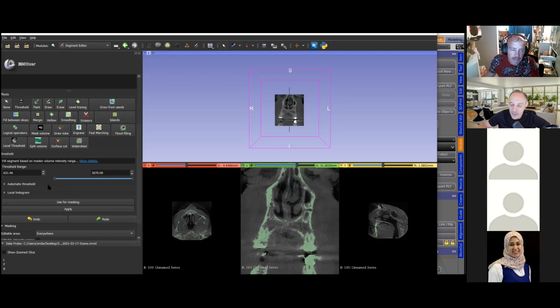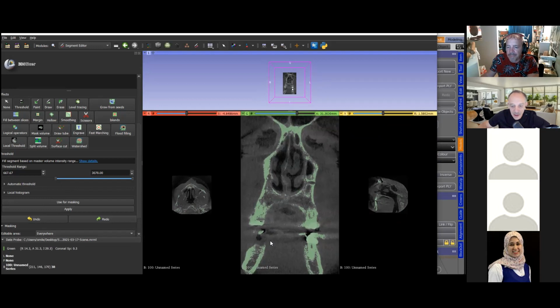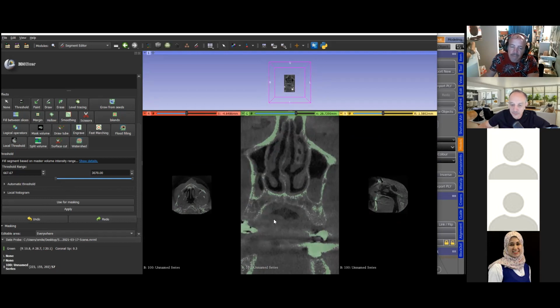Yeah, so the question is, are you trying to contain these speckles or noise to the boundaries of the hard tissue, like the teeth? Are you looking at the teeth specifically to compact the green zone into that? Definitely.